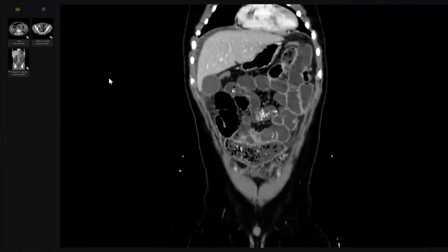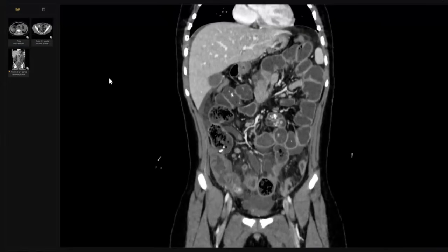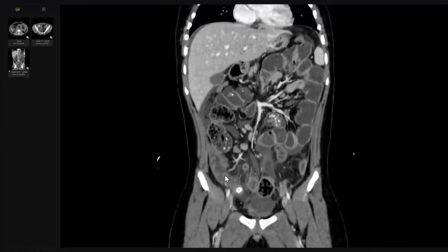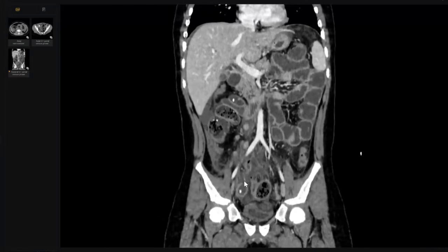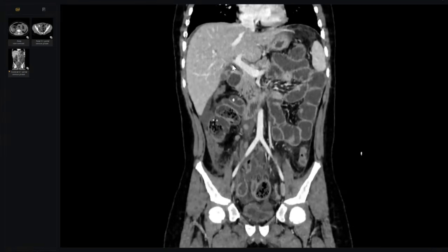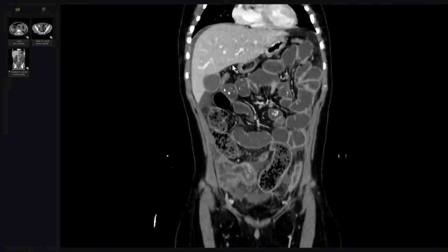If you look here, my colleague, what is this? Typical appendicitis. Somebody may tell me, doctor, see the defect here, it may be a gallstone ileus. Despite this being an illogical diagnosis, go up here and search for pneumobilia. And gallstone ileus will not cause this severe inflammation.